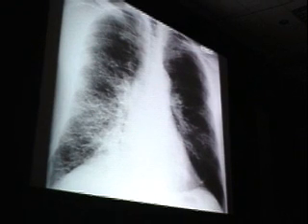Now there's one sort of Röntgen classic that you should be familiar with, because if you see it, you can virtually make the diagnosis, and that is unilateral interstitial lung disease. Again, notice in this particular case, a nodular pattern throughout the right lung, very prominent septal lines. The left lung is actually pretty normal. So it looks like unilateral interstitial lung disease.